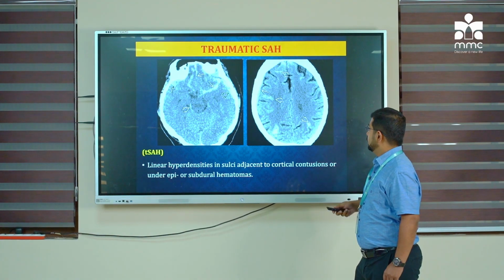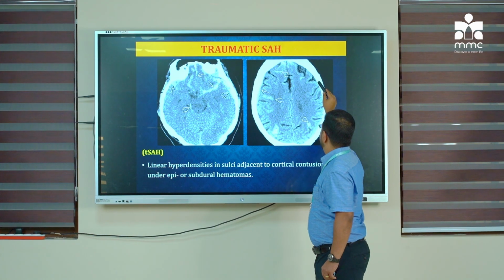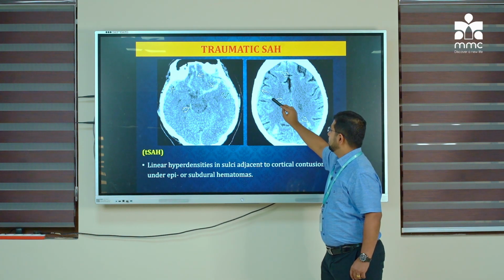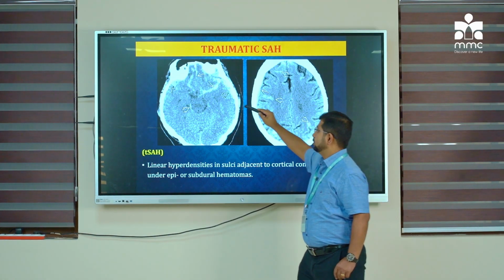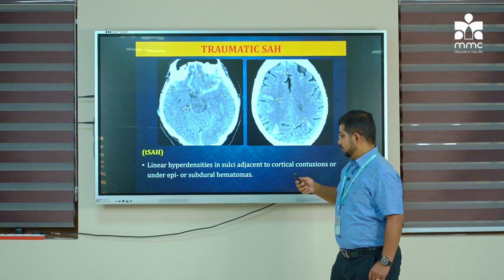As we can see on CT again, blood will be bright. Instead of the normal sulci, which are black, there will be bright areas. So we can see there is subdural hemorrhage also. Usually in trauma there will be multiple types of hemorrhage in the same patient. You can see some blood in the sylvian fissure here, this is subarachnoid hemorrhage again.